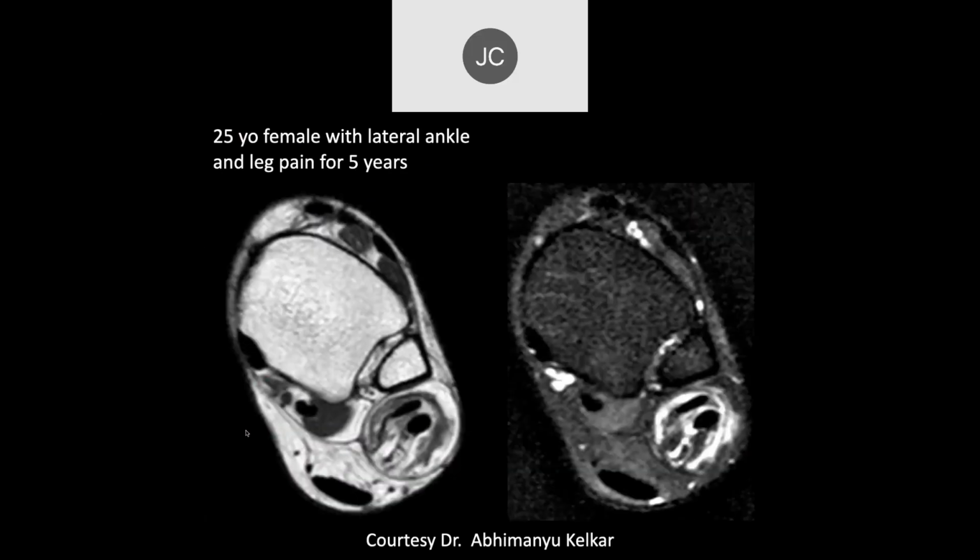Tayson. All right. It looks like we're pretty proximal here, and the tendons look enlarged. Is this a complete tear with retraction? Well, we just see that here. This is probably the tendon sheath here. It's markedly expanded. There's a lot of edema and soft tissue structures here. Do you know what this is?